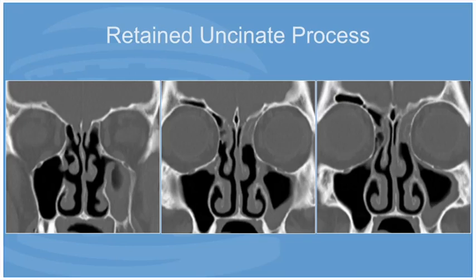And here we have just such an example. This is a patient who had undergone several sinus surgeries previously. It looks like the patient had some attempt at both anterior and posterior ethmoidectomies and possibly maxillary antrostomies.